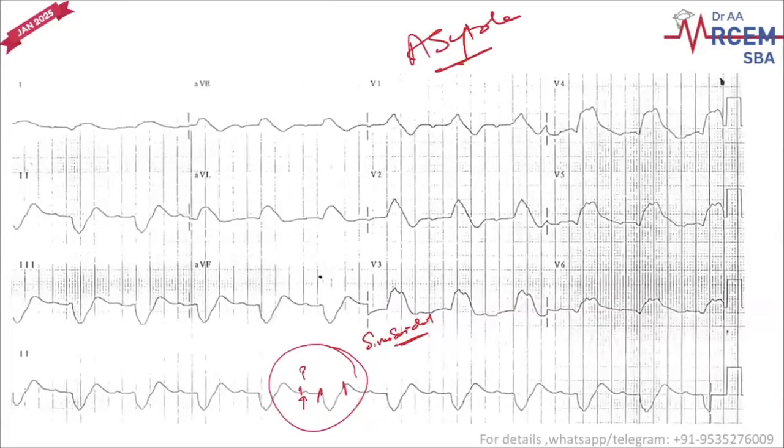This ECG pattern was given a few days back and they wanted to know what the further management will be, what you'll be doing. You need to treat the hyperkalemia. How do we treat hyperkalemia if there is an ECG change? By giving calcium supplement to the patient intravenously as soon as possible. Do not worry, we'll be learning about hyperkalemia treatment in upcoming chapters.